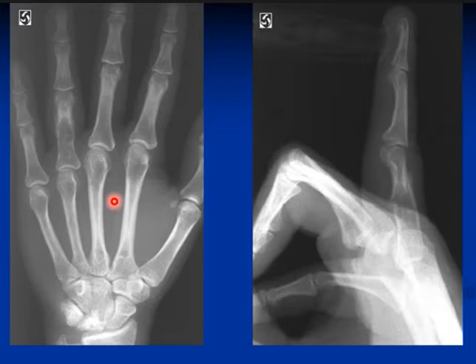X-ray of the AP view and lateral view of the hands shows juxta-articular osteoporotic changes. I don't agree with that. She's a young female. Osteoporosis is not very common. Look carefully. What do we have? What's going on here?